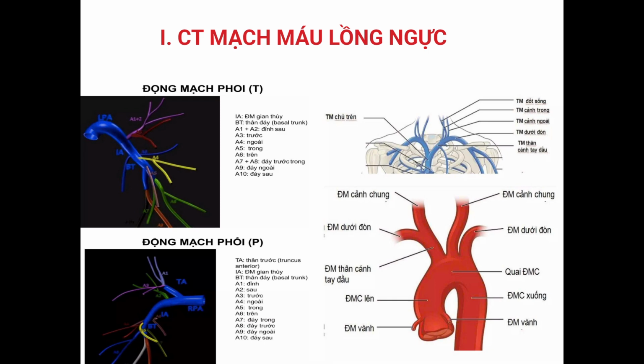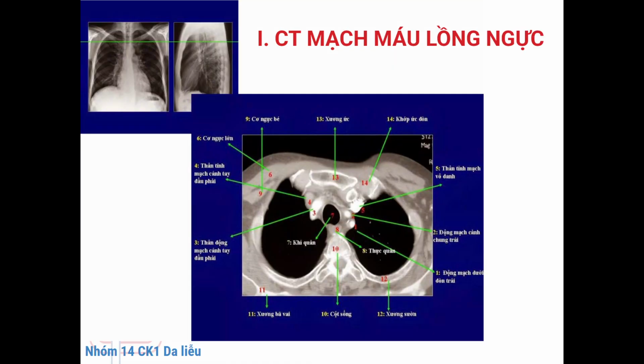When reviewing a scan, radiologists first evaluate the aorta, from the aortic root, ascending aorta, and arch to the descending thoracic aorta, to detect aneurysm, dissection, intramural hematoma, and penetrating ulcer. The pulmonary arterial system is equally critical. The main pulmonary artery, right and left pulmonary arteries, and segmental branches must be inspected for acute or chronic pulmonary embolism and signs of pulmonary hypertension.